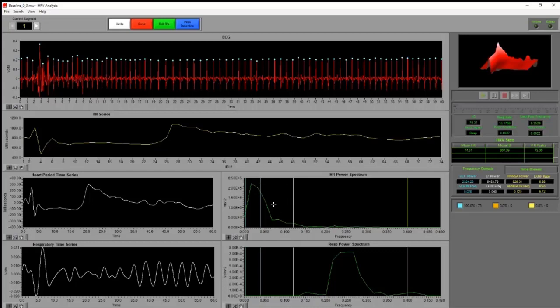The low frequency can also have some significance to you if there were specific research questions revolving around baroreceptor activity and blood flow. There is the Mayer wave, which can be analyzed in the low frequency spectrum, which you can find there. But predominantly what we're looking at is this high frequency spectrum.